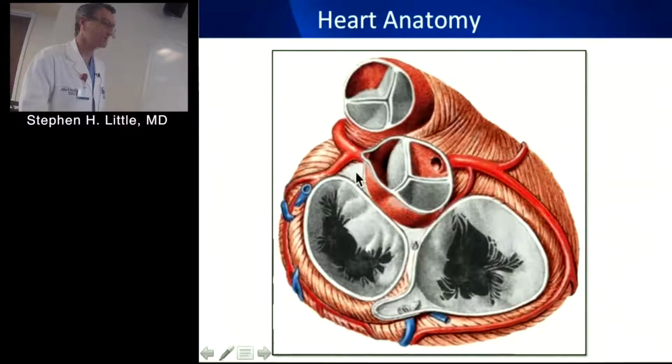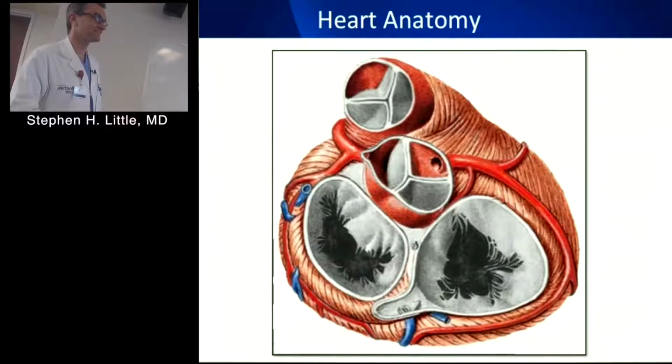For the fellows, what's the arrow on? What is that thing called? Anyone? Fibrous trigone. Yeah, left or right? Left. Yeah, it wasn't a trick. Well done. Left fibrous trigone. Your leading question. Cassie, what's that? The right fibrous trigone.